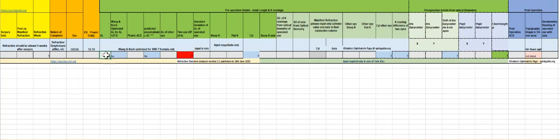The other thing I wanted to show you is the importance of the Wang and Koch optimization for very high axial length. So if you have put a very high axial length, say for example 27.9, then again it gives you a warning that this axial length is too high and beyond the average values.